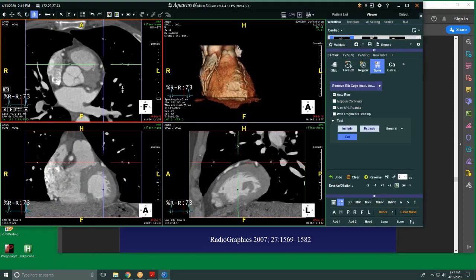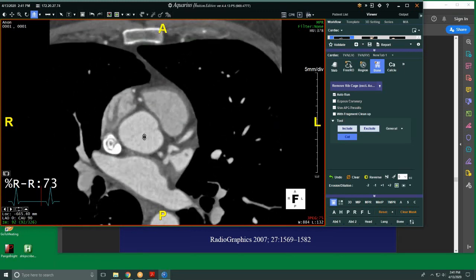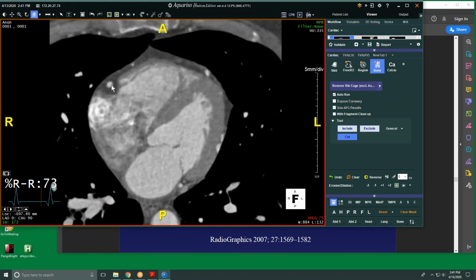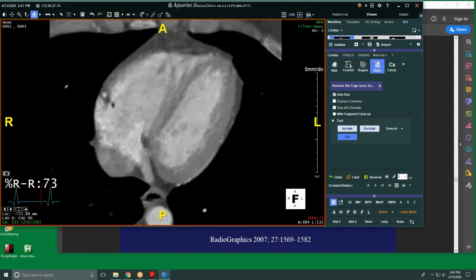And just briefly with cardiac anatomy, I'm just going to go through it over here. It's a little easier to show you guys in real time. So this right over here, coming off towards the anterior chest wall and sternum, is the RCA. Sometimes when you're looking at these coronary images, it's hard to know where you are and what vessel you're looking at. But what I like to remind people is that the RCA comes off towards the sternum, okay? And it courses in the anterior atrioventricular sulcus, wraps around the inferior aspect of the heart.